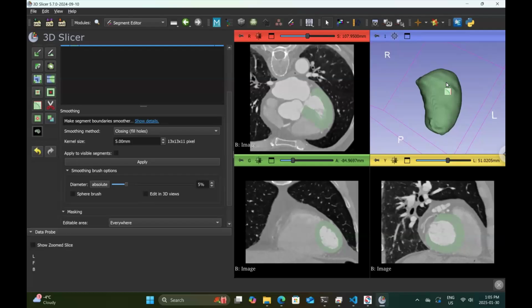Any other comments? Kia, you have something? Yeah, I had a question about the modeling, same issue from earlier. I tried adding the aorta segmentation, and this time I don't get the error regarding not intersecting, but I still don't actually see the model. It says it was completed, but I don't. Can you share your screen?